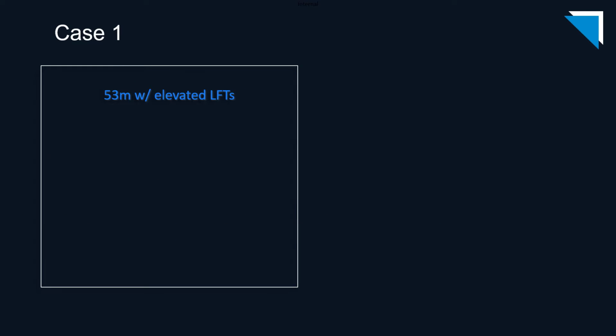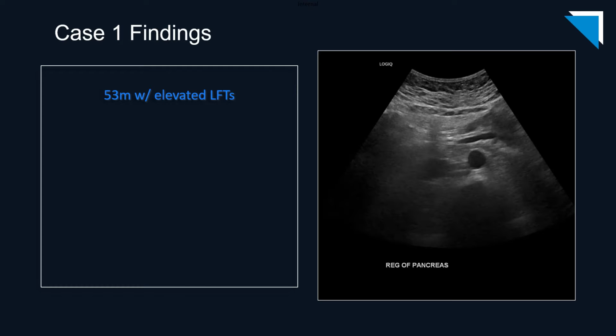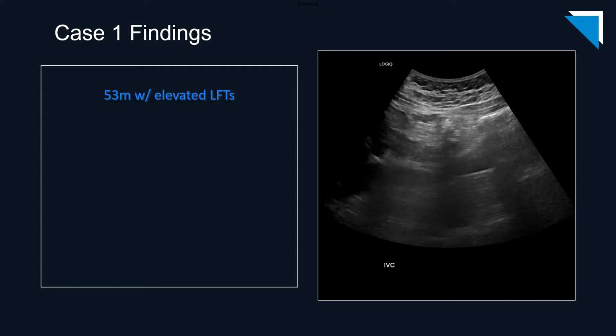Our first patient is a 53-year-old man with elevated liver function tests. These are images from a right upper quadrant ultrasound.